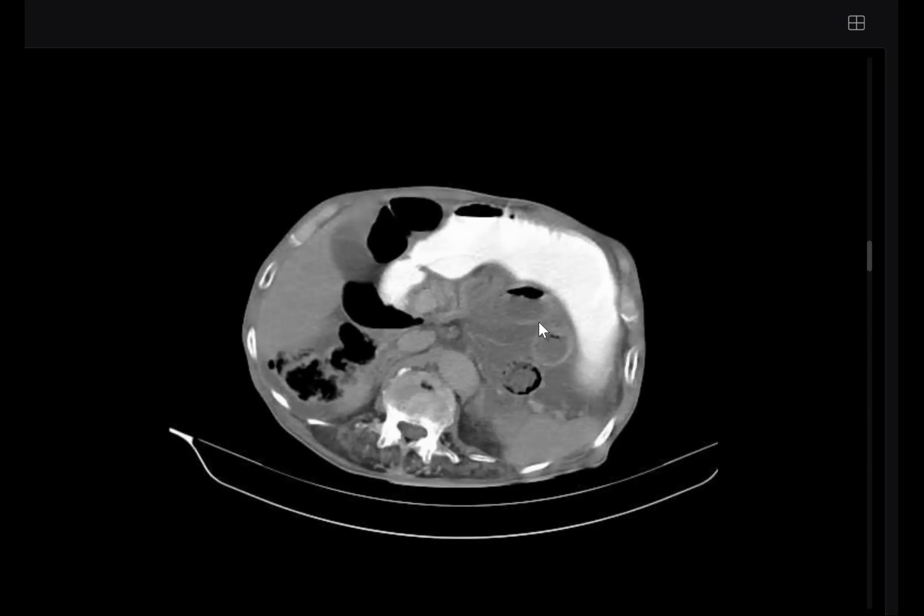Actually, it is located posterior to the stomach, and it's opening between the portal vein and IVC. It's another type of hernia. Do you know this type? It's not paraduodenal hernia. It's called lesser sac hernia. How to differentiate lesser sac hernia from paraduodenal?